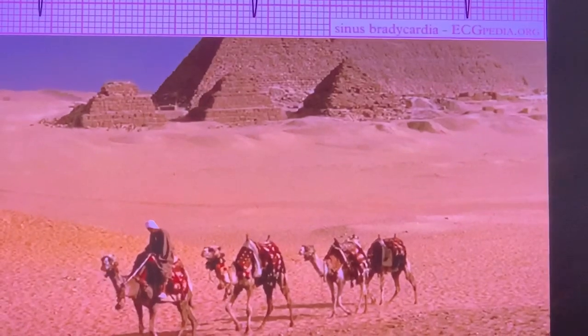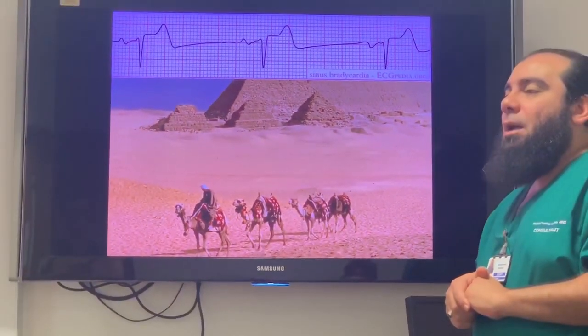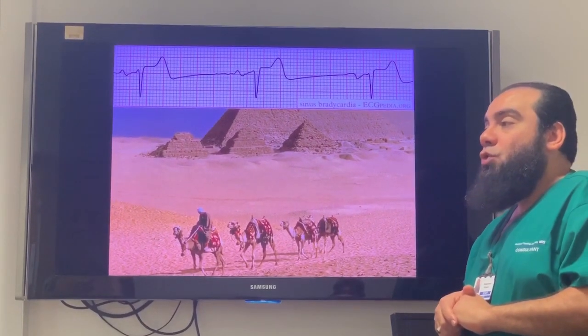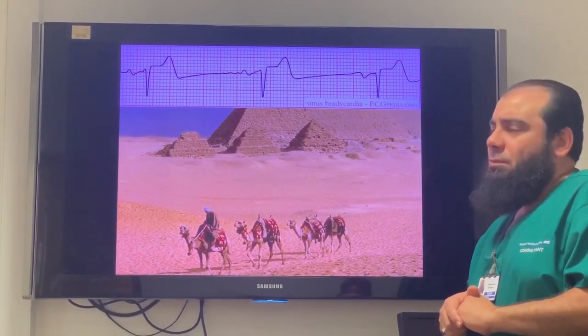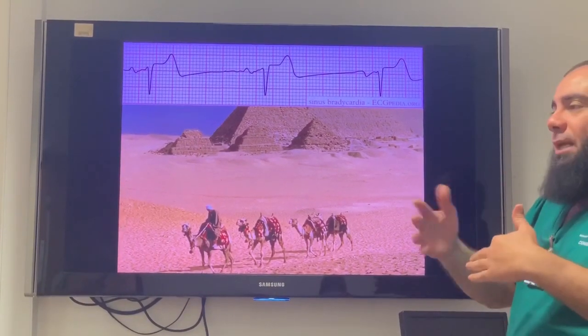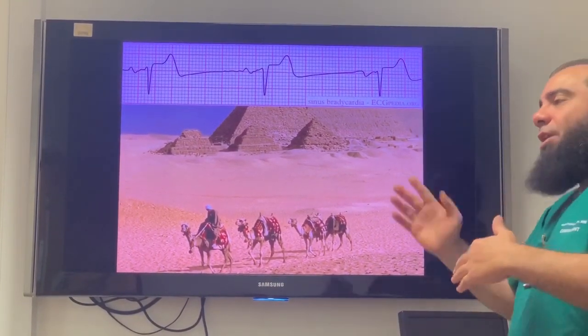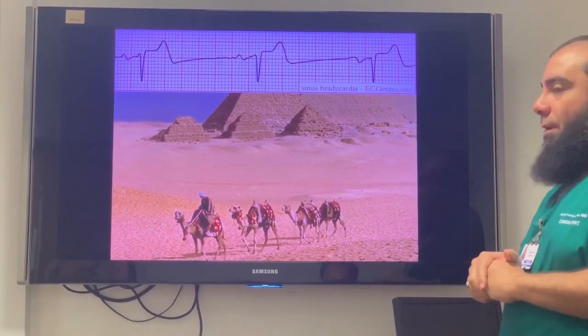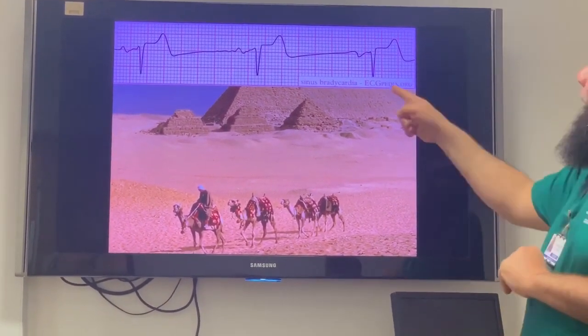What is our normal value for the heart rate? 90? Yeah, more than 90. We assume it is going to be more than normal, than over 100 obviously. So we'll give it up to 90. Okay, so how much is it here?